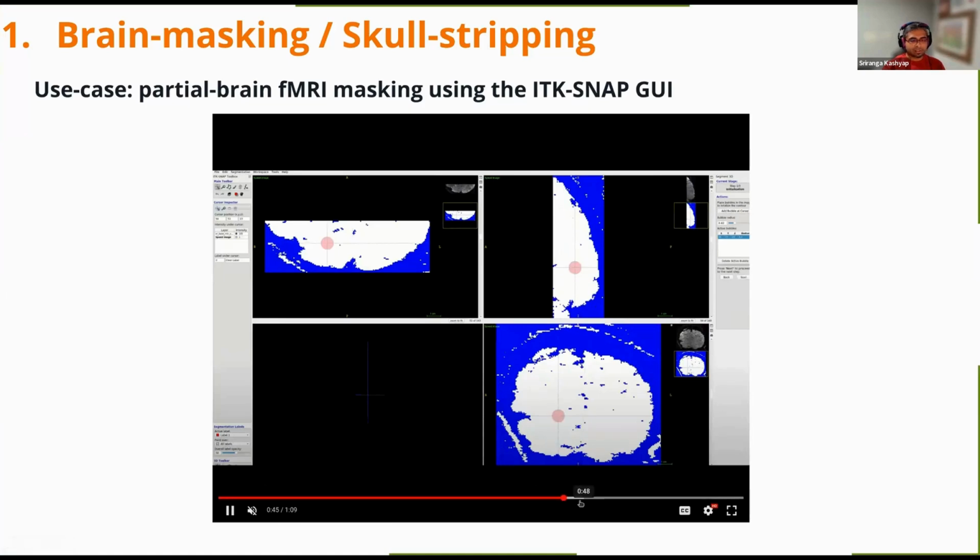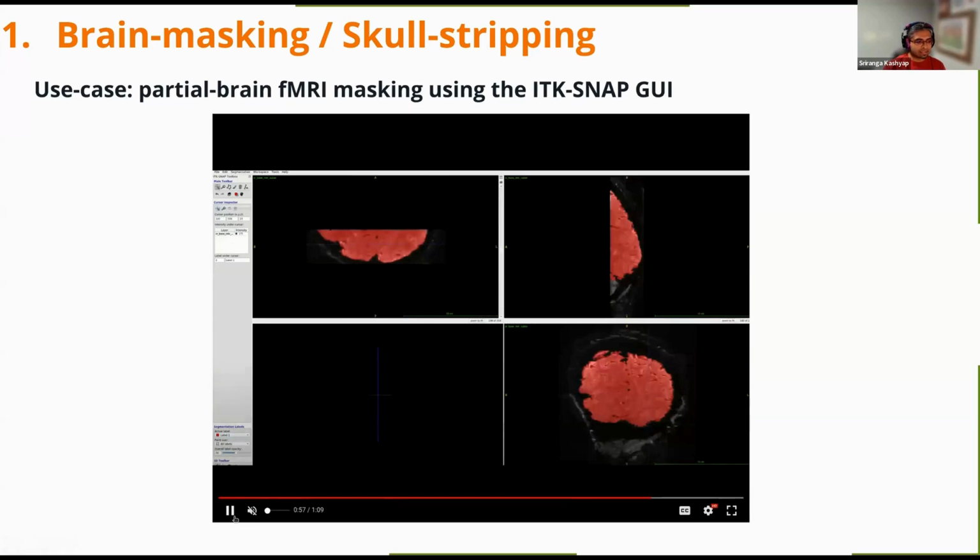And once you get an image, drop a couple of bubbles, and think of it as a way that it fills into this mask that you created. And then if you let it flow, so to speak, you end up with this nice little brain mask that you can use for the rest of your analyses. It's quite fast. Once you get used to it, it takes about 30 seconds for the data set.